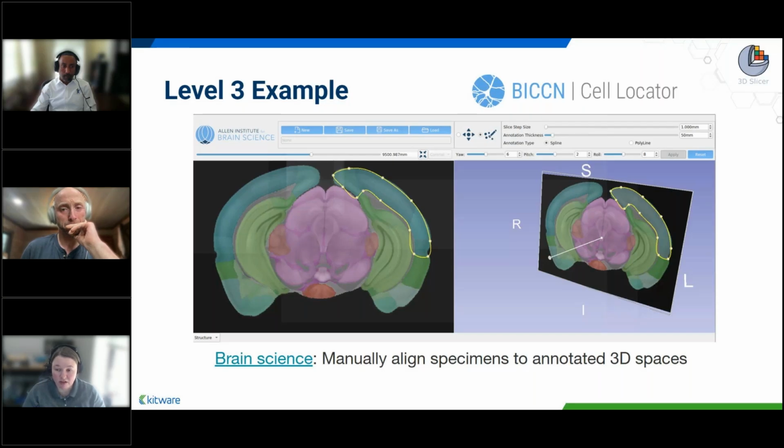As you can see, the interface is customized for the specific workflow. This looks like a very streamlined, very smooth interface, but under the hood, it's the exact same 3D Slicer that you can download from download.slicer.org. But it's streamlined, focused, and branded for the organization. And this is really how powerful it can be. You can fully define your own UI while still making use of all of the already implemented and powerful features that are available in 3D Slicer.